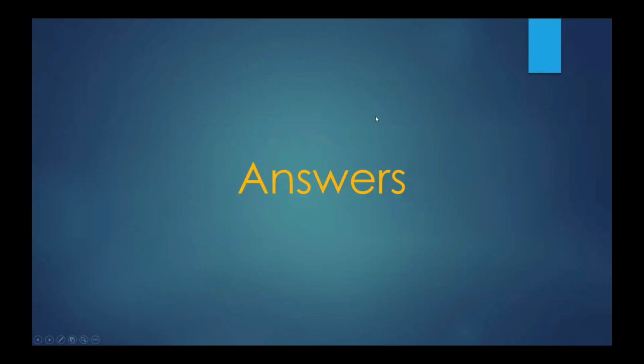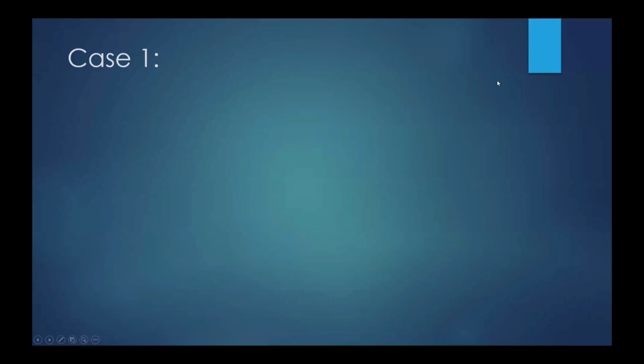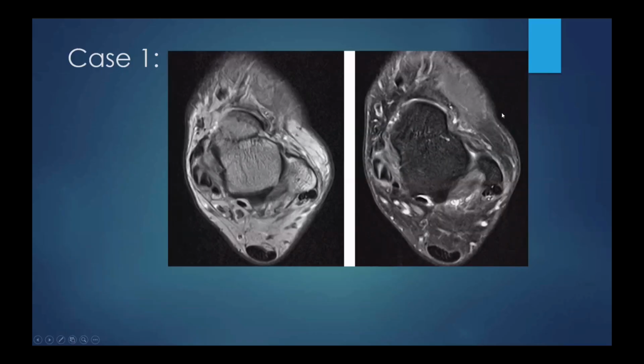So let's get the answers of the first case. Does anyone know the answer of this case? If you know, you can share it on the chat box. Okay.